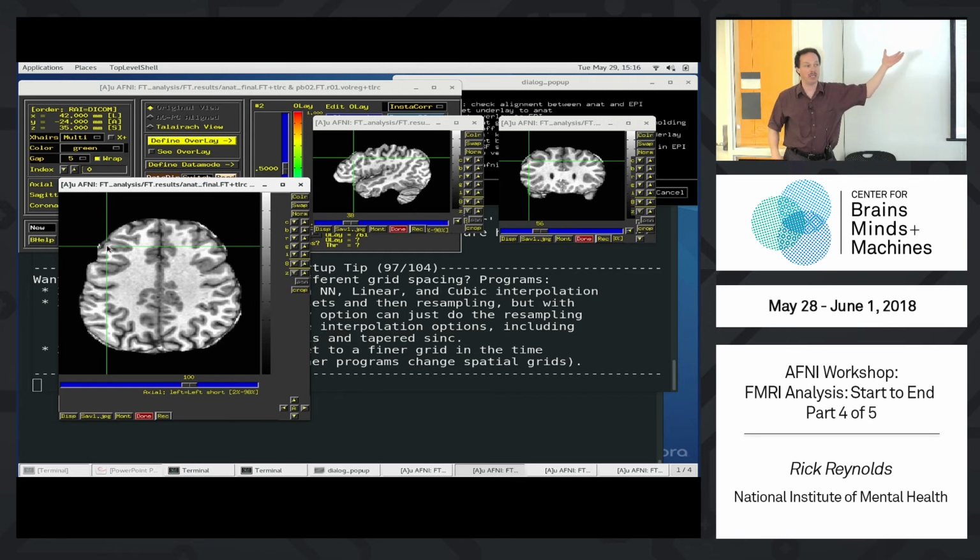We use this contrast that is fairly well driven by the CSF to do the registration. A lot of times registration is performed using mutual information or something like that. And mutual information will put the stuff on top of each other pretty well, and you won't get messed up very often. But if you look at it like this, it's actually not very good. The mutual information is not going to end up following the contours.